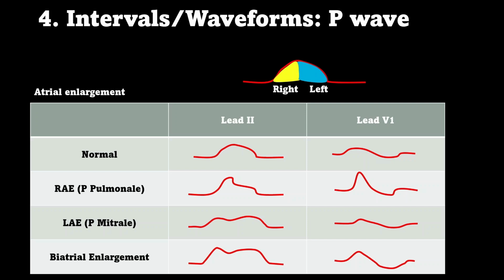The end part of the P wave will also be greater than 1 millimeter depressed and will have a duration of over 40 milliseconds. At the end of the day, all the numbers I'm throwing at you aren't as important as the physical morphology of it, because as I said, 12-lead interpretation is mostly just patterns.